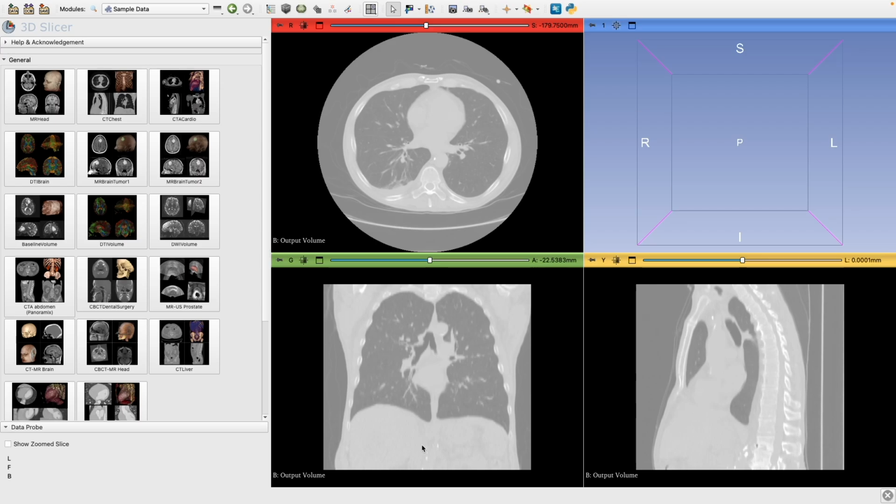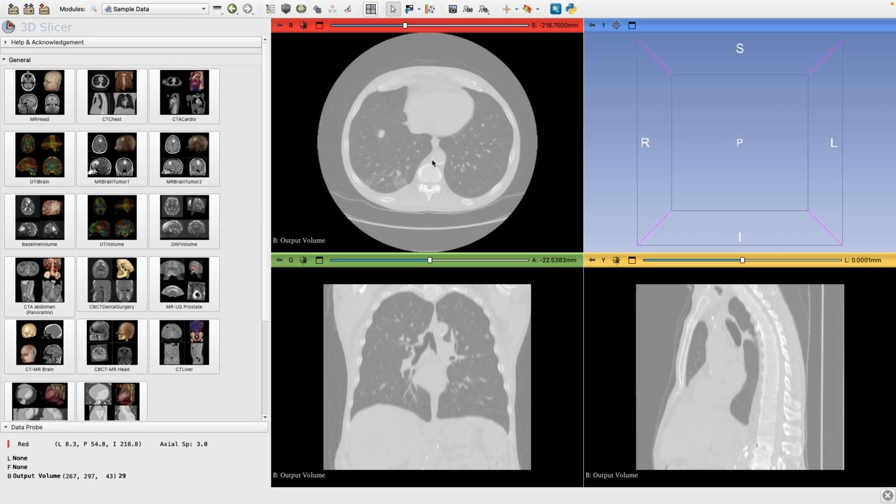How's it going, everyone? Today I wanted to make a quick video about how we can change the width of whatever slice that we're segmenting in 3D Slicer. In order to record this video, I've taken this de-identified sample data that's from 3D Slicer itself that anyone can access if they download 3D Slicer. And here we pulled up a CT scan of the chest.